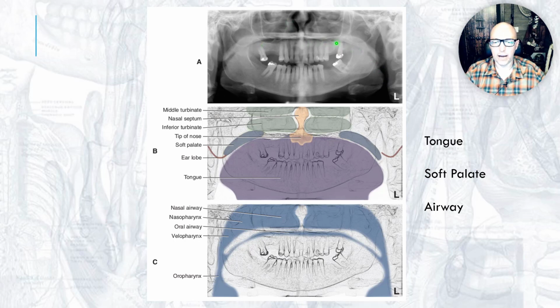They left a little air gap between the tongue and the palate, so we'll call that our palatoglossal airspace. Here's the hard palate line. Sometimes it shows up more distinctly than others. The hard palate, you follow that back, it should connect with the soft palate. So things make sense, right? One thing connects to another. You should know your anatomy. And what's at the bottom of the soft palate? You have the uvula, although that doesn't always stand out very well. This one does coincide, what do they have labeled here?